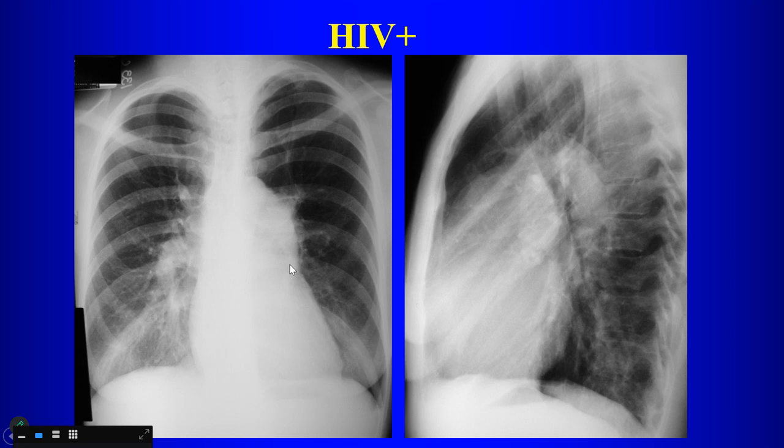Is that lymphadenopathy or is that something else? It's enlargement of the pulmonary. Which pulmonary artery? Not left, but main pulmonary artery. This is enlargement of the main pulmonary artery. There's another finding on the lateral chest radiograph that also tells you that you're dealing with pulmonary artery enlargement, besides the pulmonary arteries. What is that finding on the lateral chest radiograph?